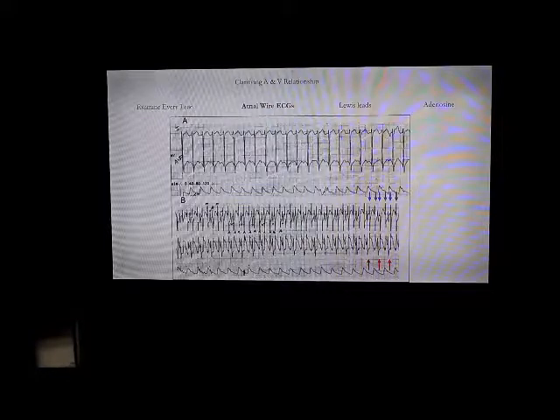Okay. So this patient has this rhythm. Let's say tetralogy or Fontan postoperative, and he has this rhythm, okay? Narrow complex. This might be the P wave, or this might be the P wave, or these are all T waves. There's no P wave here, so I'm not sure if this is sinus or not. Okay? So the way you differentiate, I need to know where the P wave is. If there is a P wave before the QRS, it means it's most likely sinus, especially if the rate is acceptable.